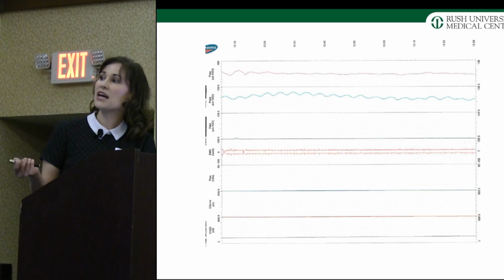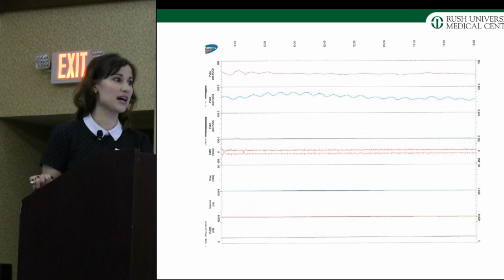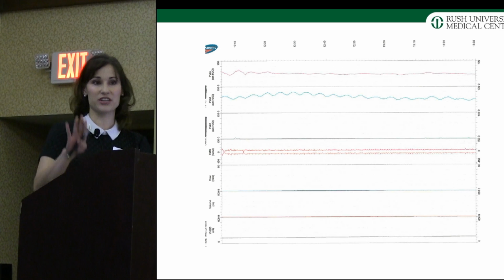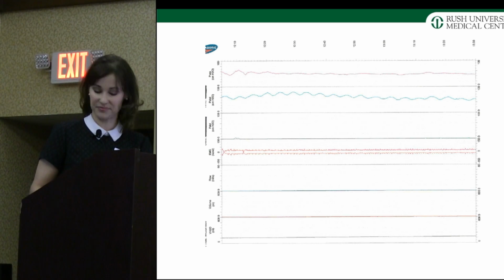This blue line here is your abdominal catheter. Can anyone guess what's going on here? This is peristalsis. Sometimes that'll throw you off. You're going to see the peristaltic waves there during a urodynamic study.